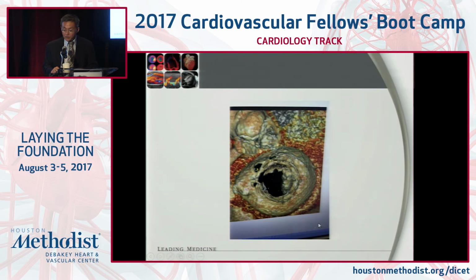The other major indication of cardiac CT is assessment of prosthetic valve dysfunction, especially with paravalvular leak, aortic position, before they go ahead and do the plug. CT is very useful in assessing the location and the size of the leak.